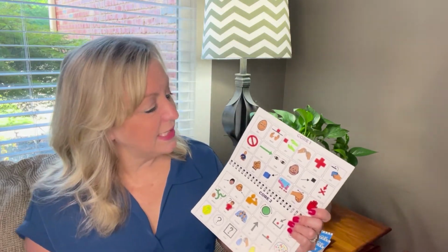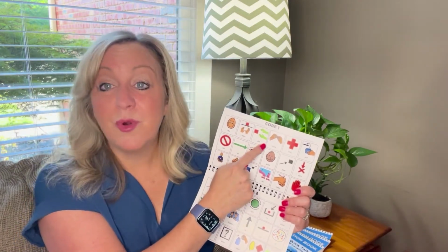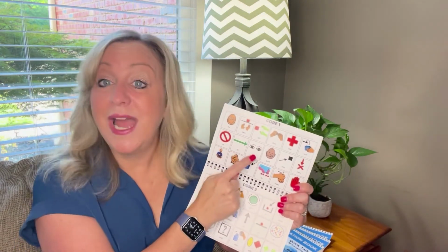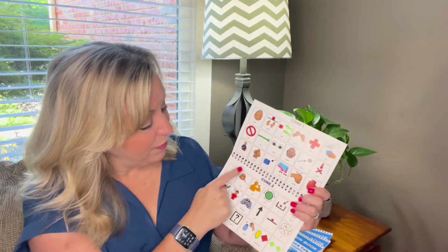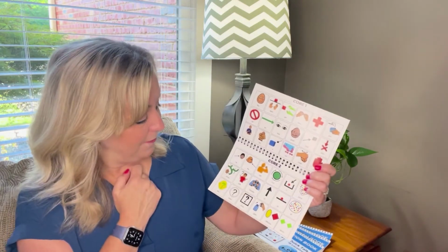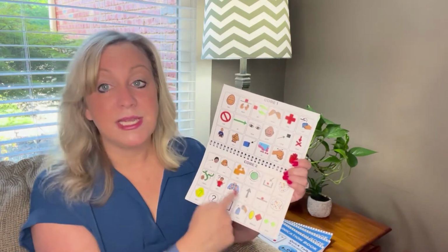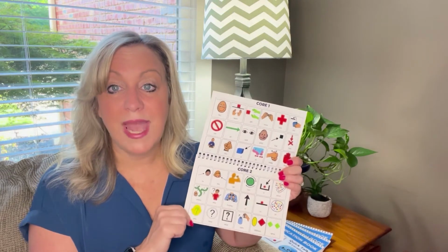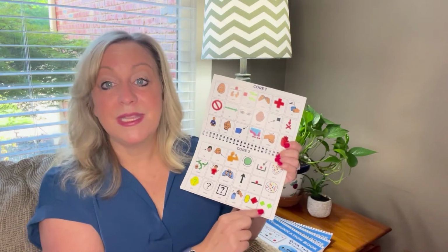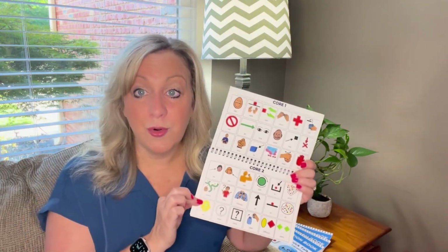So you'll see things like, I like it. What do you want? Let's go get some more materials. You might say things like, it's time to go to the cafeteria. I need you to look at this book, right? We might say it's time to make something in our art class. I need you to do it for me. I can do it. Give me all of the pencils. So there's lots and lots of messages that go along with things that we talk about in our classrooms. In our math classes, we talk about things being the same and different. We compare and contrast. Those messages are all here on our core vocabulary page.